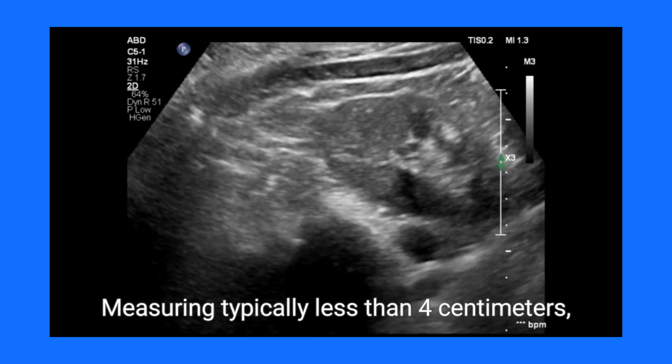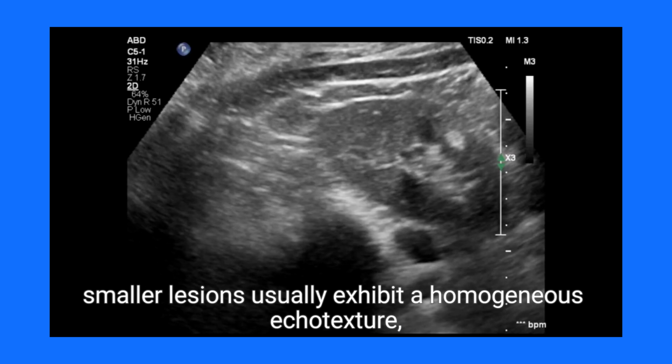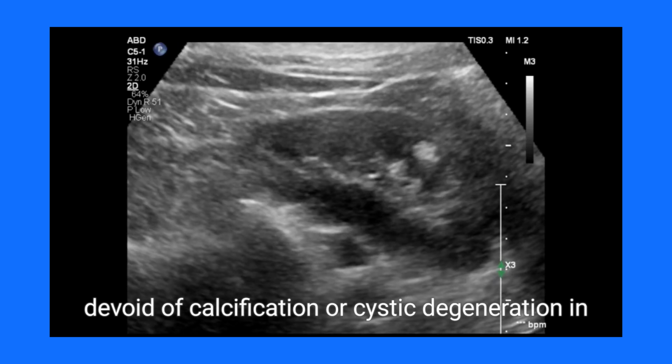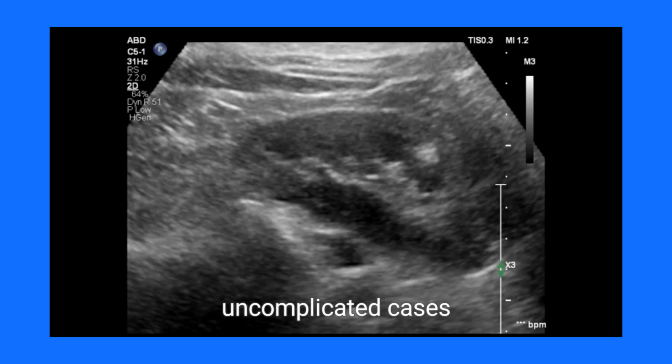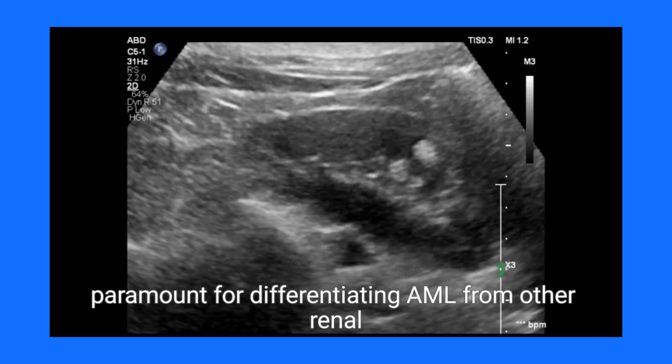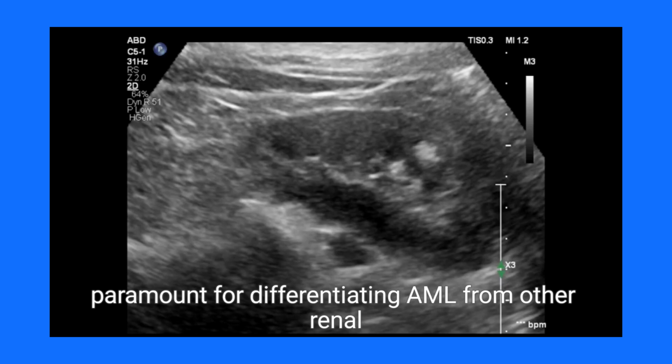Measuring typically less than 4 centimeters, smaller lesions usually exhibit a homogeneous echotexture, devoid of calcification or cystic degeneration in uncomplicated cases. This clear recognition on grayscale imaging is paramount for differentiating AML from other renal masses.